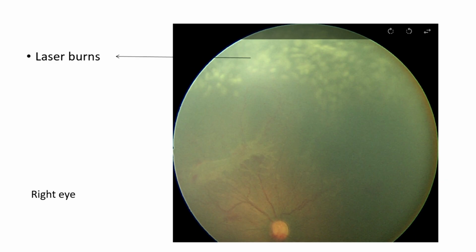These are islands of condensation of vitreous. What are they? Correct, they're vitreous condensation, but what are they condensing on? On the avascular junction of the vascular and avascular zone, sir. Anybody can guess? Speak into the mic.